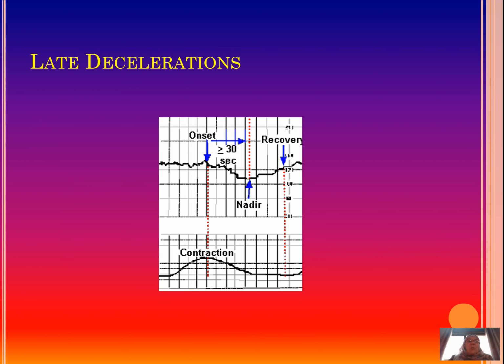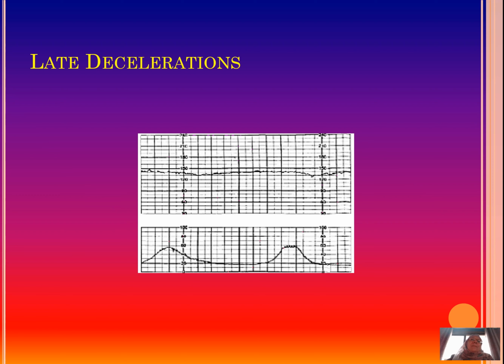decelerations, because their compensation is delayed, and it is very worrying if they show late decelerations, because this is exactly the delay in coming back to normal and compensation after a contraction that shows the baby is actually not well. This is our late decelerations.